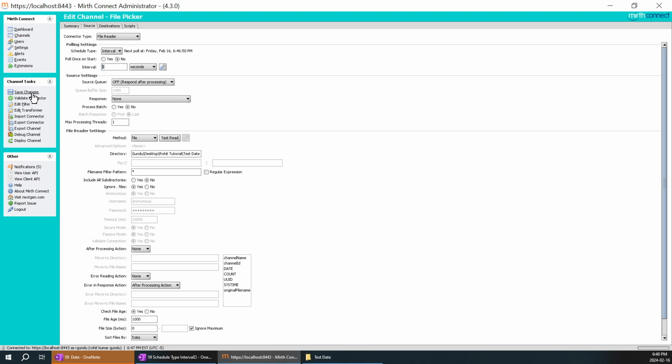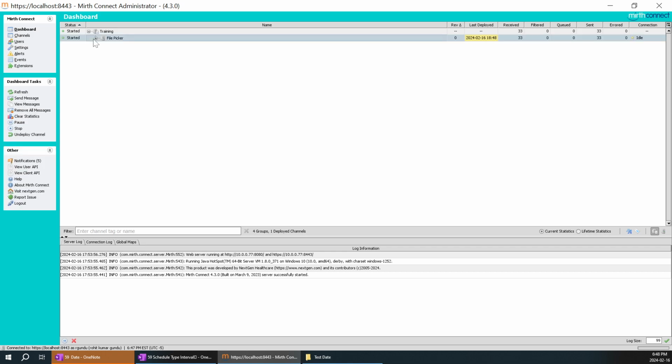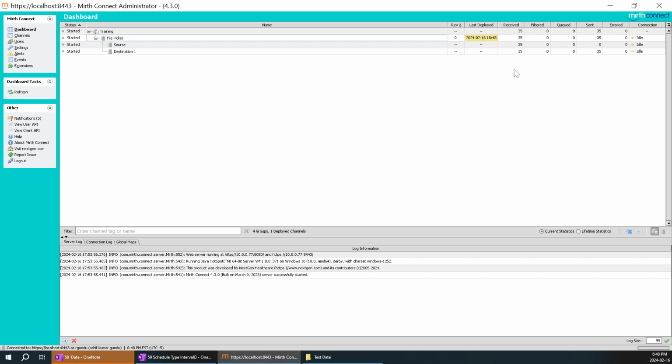So what we'll do, we'll save it and deploy the channel. Over here, you can see it has previously picked up 33 times. When I refresh it, it should pick up again. So you can see for every 5 seconds it starts picking up. I'll keep on refreshing it. It became 36. Now again I'll refresh it. It became 37. It means each and every 5 seconds it's picking up the file. It doesn't matter in this session what type of details are in the file.